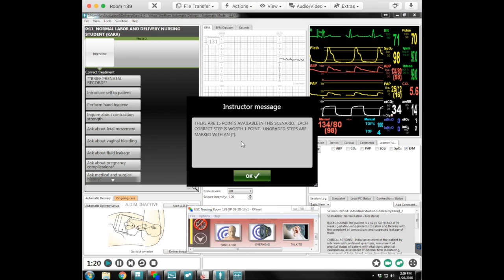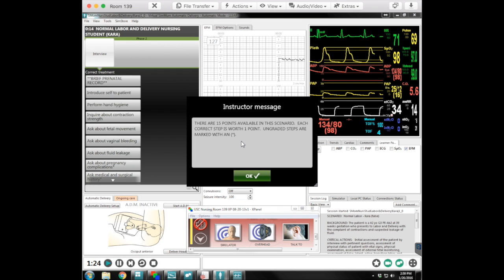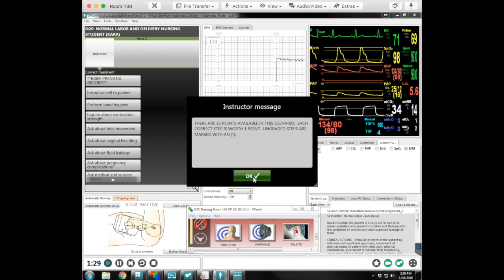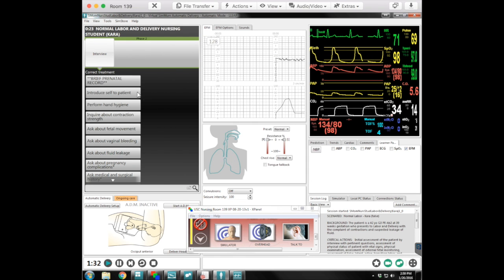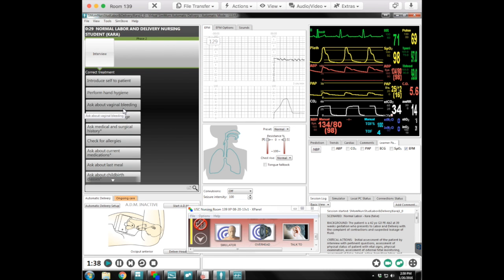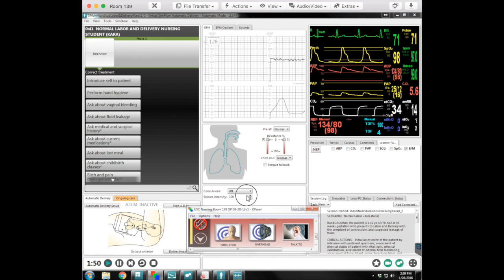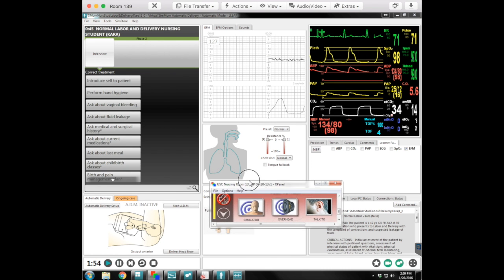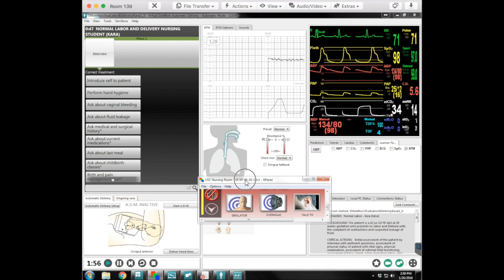If you're brand new at this, we typically try to match you up with a person that has run before, or I will take you through those steps personally before you even run. So just know that primarily you're going to be interested in doing these things here, which are just a checklist activity. This particular scenario has canned responses in it, so there's that going for you.